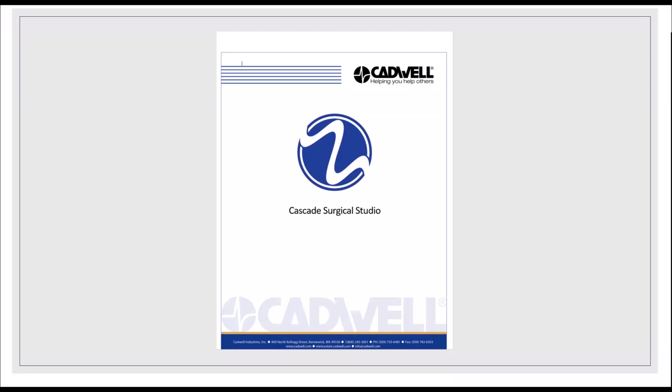The Cadwell Cascade Surgical Studio CadX simulator can be utilized by both trainers and trainees. The student or trainee may use the simulator for self-guided learning, whereby the trainee adjusts parameters within the control panel to experience likely outcomes in a controlled environment or to simply see what happens.